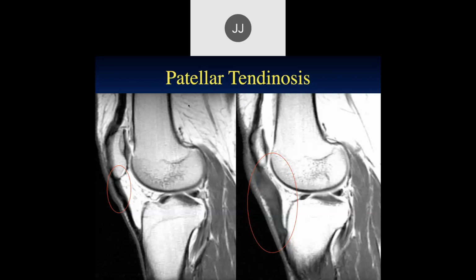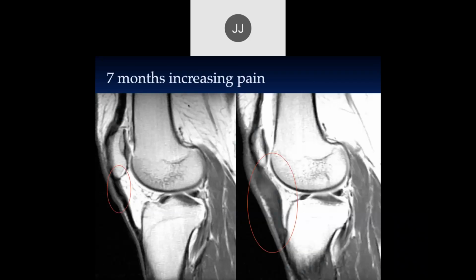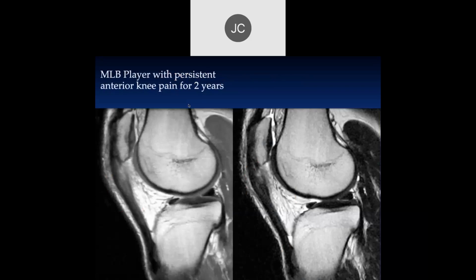I do not know. You look at the skin, it looks abnormal, so it looks like kneeling or something of that sort. I don't know. Okay, what do you think of this one, Taysom?